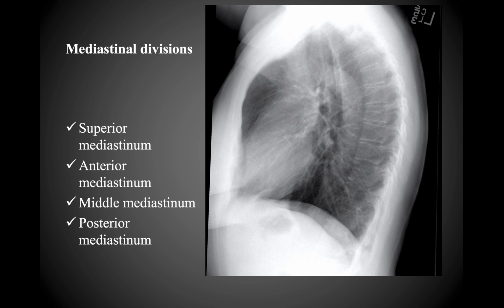This lecture is going to cover some of the aspects of the mediastinal divisions, so we're going to review that, and then we'll move into going through a number of different scans to look at examples of structures that we've already discussed thus far. So remember that the mediastina are broken down into multiple different divisions.